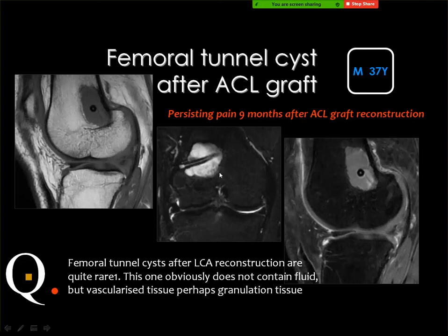And according to the literature, this is not an indication to reopen or redo the case. This cyst will heal, and the screw is not loose in its place.